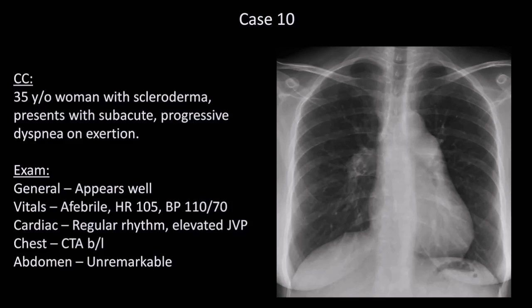Now, so far in this self-assessment, I haven't gone through the other chest x-rays systematically using the A through F system. This wasn't because I don't advocate for a systematic method, but was more out of the interest of time and because it would be a pretty darn boring video to hear someone else going through the 15 x-rays systematically, especially when the location of pathology is pretty evident with most. But in this case, the pathology is more subtle, so let's practice the system.